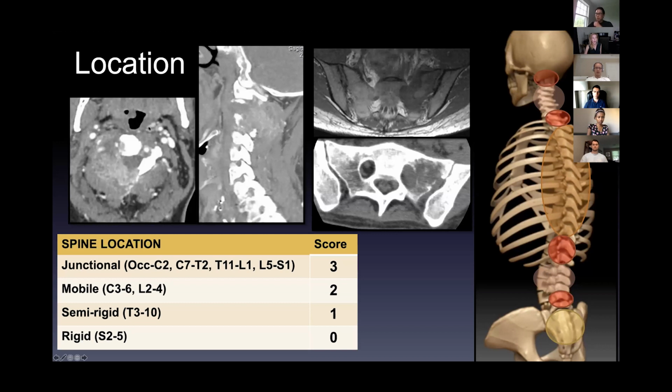So this first case, an axial and a sagittal CTA, is renal cell carcinoma. You can see this metastasis is completely replacing and destroying the posterior elements here on the right. It's displacing the vertebral artery anteriorly right here. On the sagittal, you can see there's no bone left that's holding the head on the cervical spine, so the head's going to fall off. So this is a devastating place to have a metastasis. Very difficult for you to treat, and I'll ask you about this in a second.